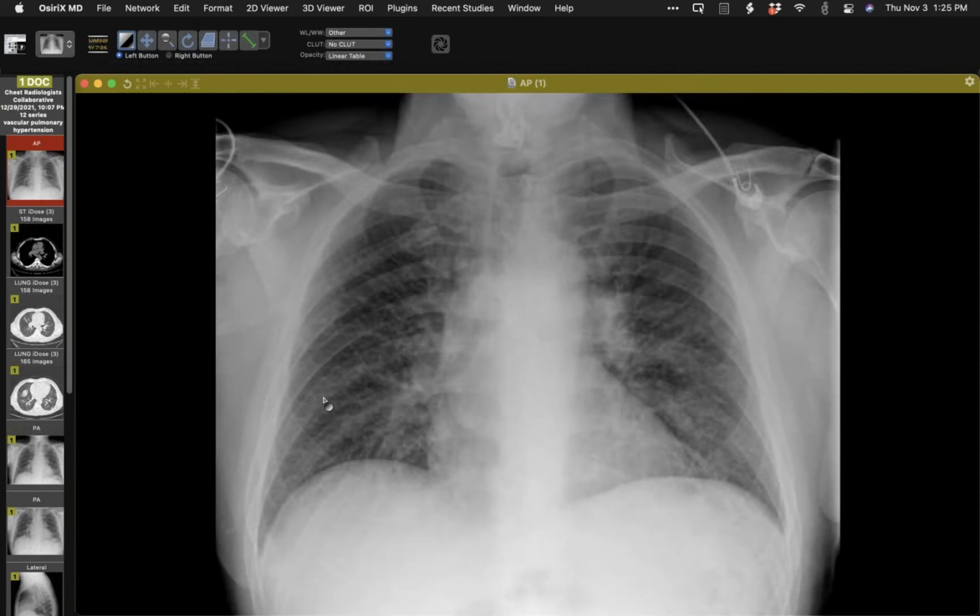So with that as a prelude to this patient, I'll show you this. Now, the quality of this outside image isn't that great, but if those of you looking at this in real time perceive maybe reticulation, that something's wrong with the lungs, you're right. So this goes back to December last year. Then he has a CT in February.